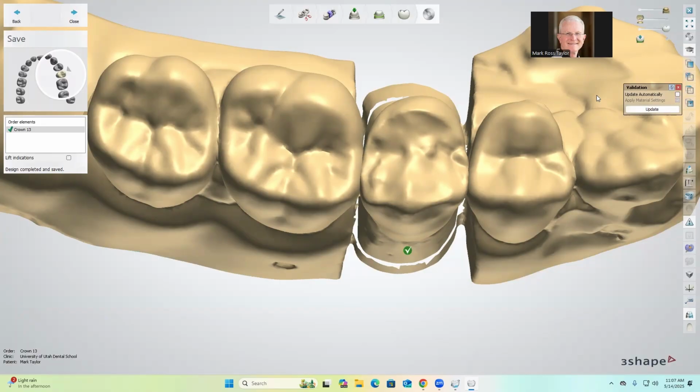It will fill those in, but I think for the grading of the project, it's more important to have the minimum thicknesses and your contact positions correct than having all your exact supplemental anatomies and your triangular ridges. It's best to have a very good go-by of what the crown should be for the physical standpoint of the crown. Once that's done, you can say the crown's finished.